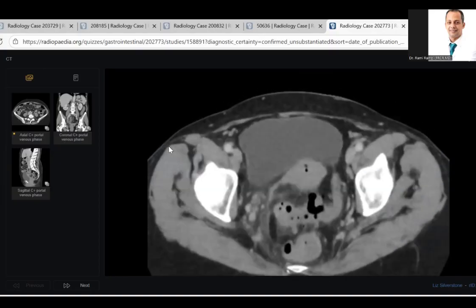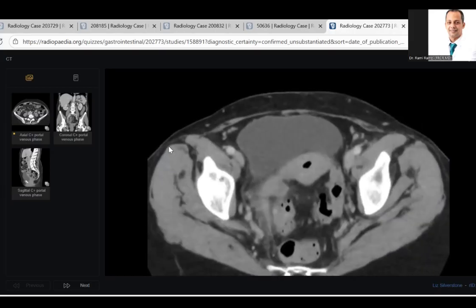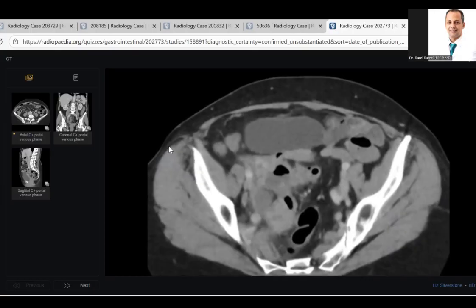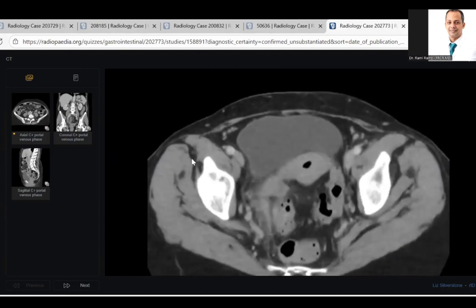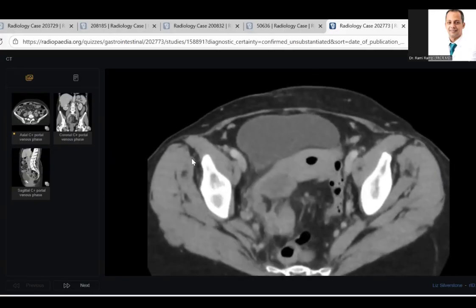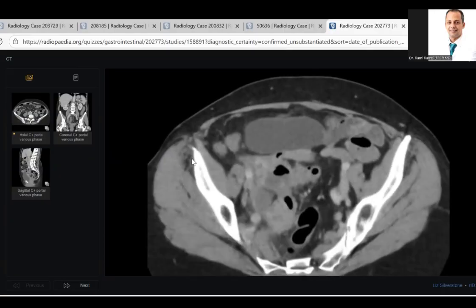Sir, I am thinking along the lines of tubo-ovarian abscesses and endometritis, or some fistulation, because this air in the uterus is not normal. I would like to correlate with any history of passage of stool through the vagina or any other complaints like that, because there could be some complicated diverticulitis with the resulting this.